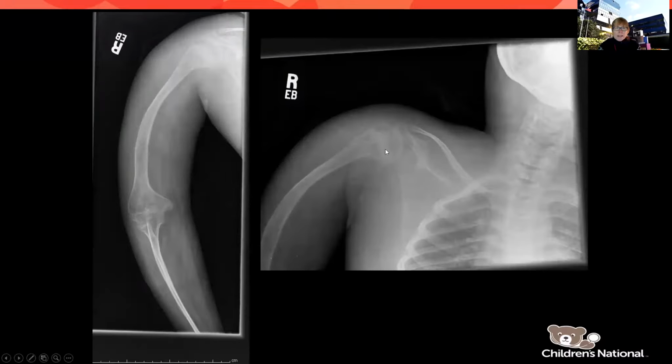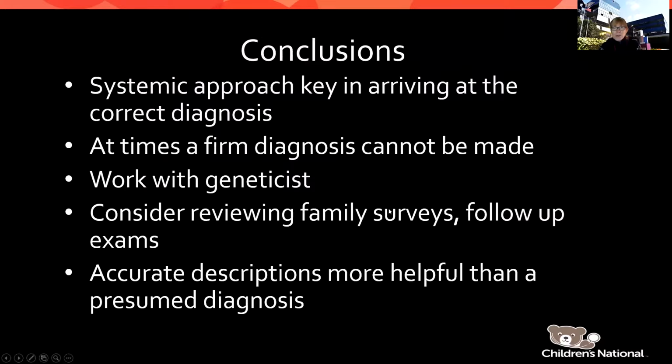These are your more classic type 3s that Dr. Tosi takes care of a lot of, and you can chime in. But we see them quite often when they come in with just a little crack, and we'll look for these subtle fractures, which we can miss because you can see how abnormal the bone already is. It's very thin, osteopenic, and those little stress fractures can be quite subtle, and all the bones look pretty abnormal. So if you have a patient that really has a lot of pain and we're saying no fracture, we could definitely be wrong, so help tell us where you're really worried the fractures might be.